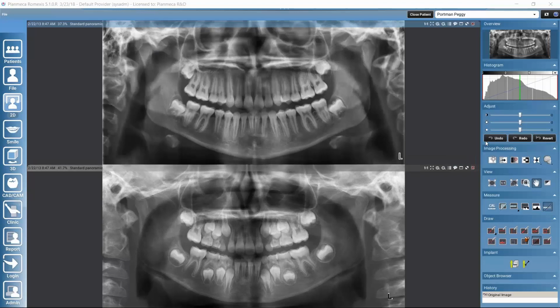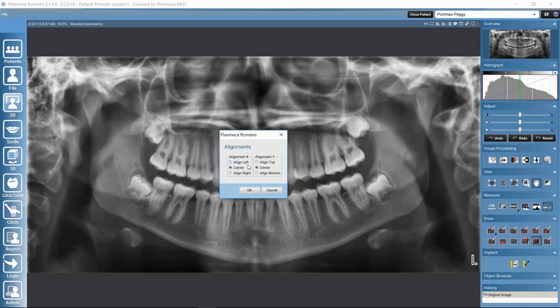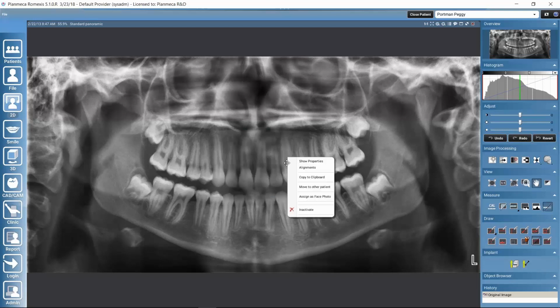Okay, so that was about working on several images. Let's close the other image so we can focus only on the one image. So we still have some shortcuts here if we right click on top of the image. So from here we could access the properties of the image. We could align the image. For example, if we would have here several images, we could align whether the image is aligned to the bottom or the top. So now it's centered here in the image viewing area.